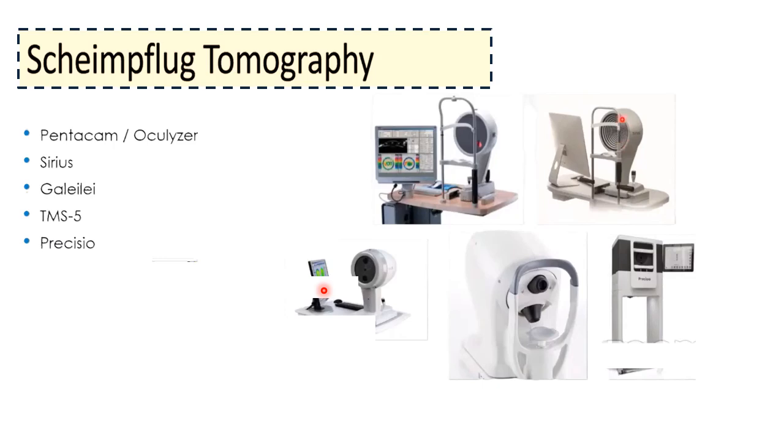This picture shows the different commercially available tomography systems in the market.